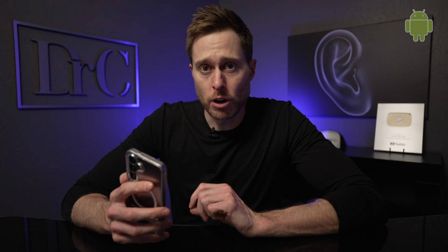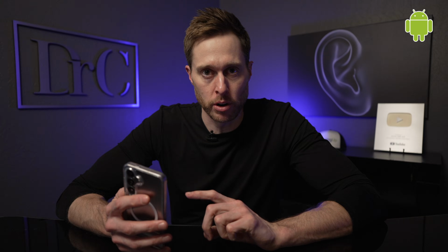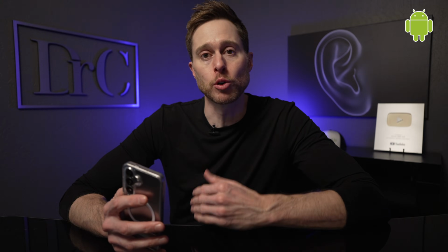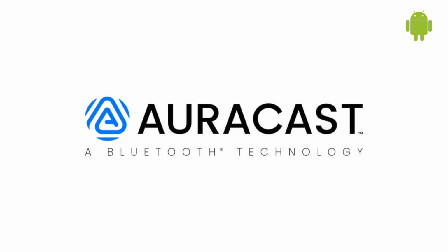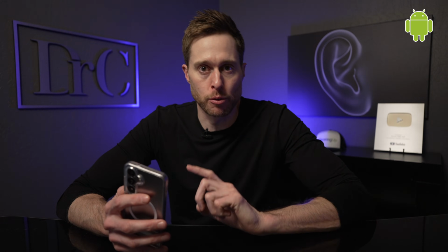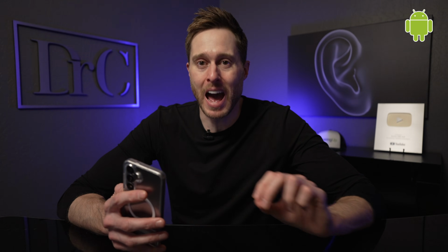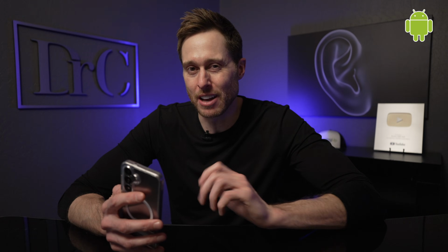All right, so the cool feature I want to show you using an Android device that has LE Audio, Bluetooth, and Auracast is your ability to tap into an Auracast broadcast signal using your Starkey hearing aids. So this is not something that you do inside of your MyStarkey app, and this is, again, not something that you can do with an Apple device. It has to be an Android device as of right now.